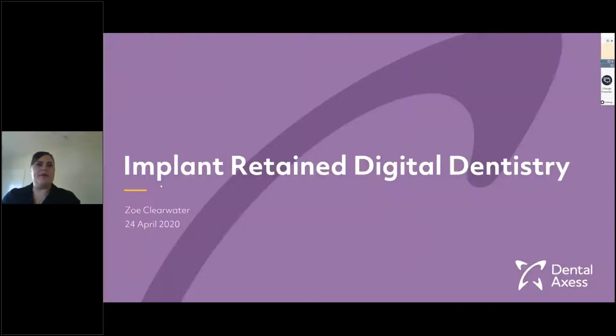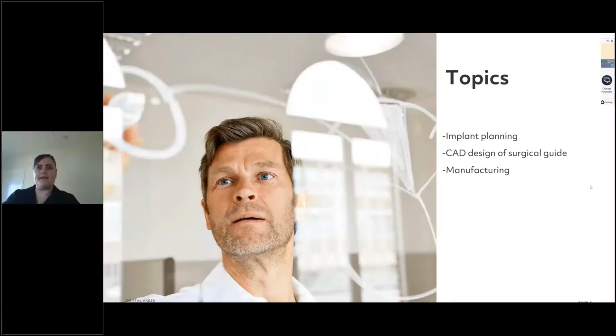This morning I'm going to be running through implant retained digital dentistry and running through the 3Shape Implant Studio software. Okay, now the main topics that I'm going to be covering is the implant planning, the computer-aided design of your surgical guides, and also touching on the manufacturing. So overall, I'm hoping that you'll get a good understanding of how using technology is going to make this whole process more efficient.